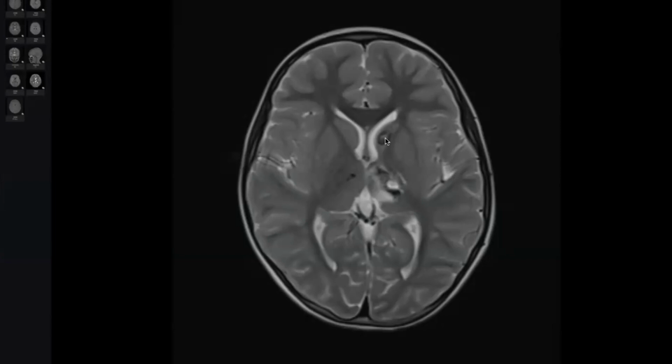What is the differential diagnosis of multiple signal drops in MRI? If high SWI, could be hemorrhage. Trauma like diffuse axonal injury, but no history of trauma. What else?